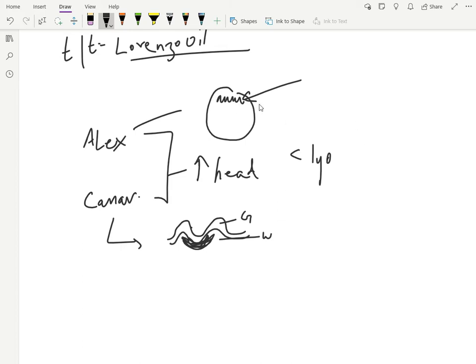In Alexander disease, besides involvement of the frontal white matters, you have enlargement of the caudate heads. And there is enhancement of the white matter involvement on T1 post contrast sequences. Significant enhancement.